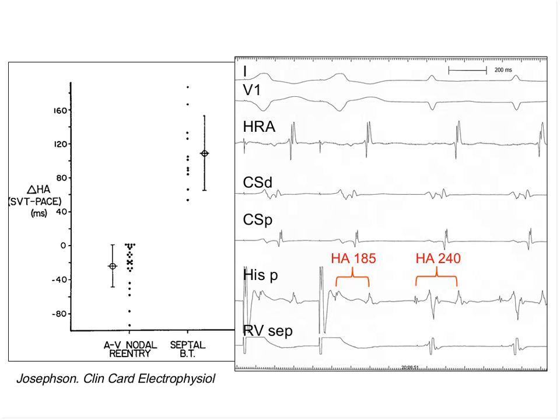Absolutely. Obviously the activation sequence is very important. There's no question about that. It is very important, for example, in this case, because it is clearly an eccentric sequence. But sometimes this is not the case. Or sometimes it's hard to catheterize the coronary sinus.